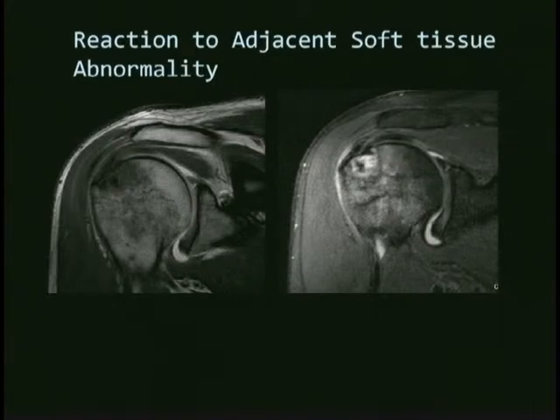Now, as often happens, the MRI was obtained before the plain film, so we have this pattern of edema, not a clear fracture, and he didn't have any history, you know, playing golf and developing a fracture. It seemed a bit stretched, so finally we saw this little low signal here in the bone marrow, and that is actually calcification that has eroded into the bone and causes this severe inflammatory reaction in the bone.